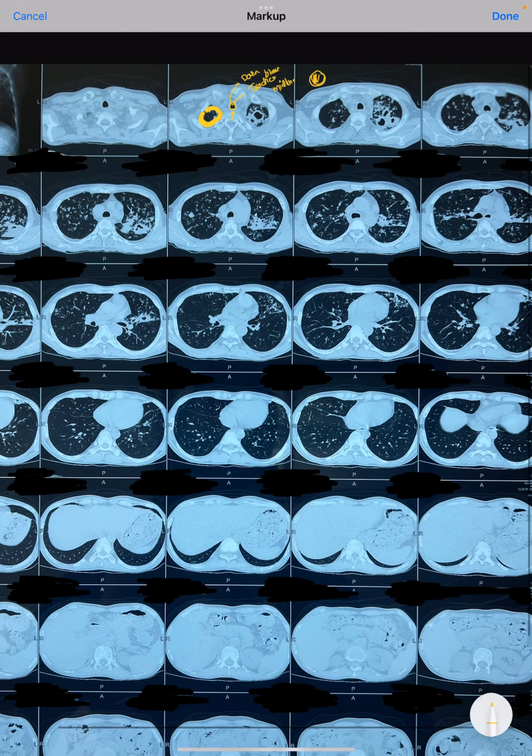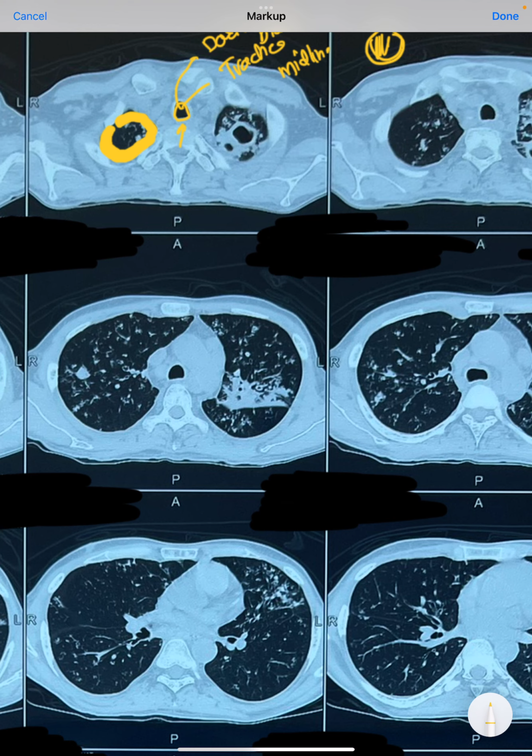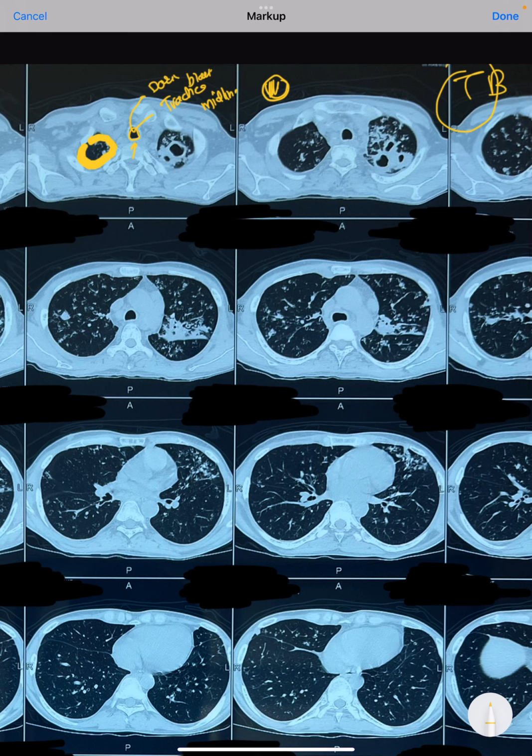With this type of cavity, almost always you have to think of tuberculosis, because in TB the formation of cavities is extremely common. And what we need to know is that such cavitary lesions give so much opportunistic chance for infection. The risk of opportunistic infection markedly increases if there is a cavity, because the immunity here, all the CD4 cells, CD8 cells, or the local immunity cannot effectively combat the bacteria, or viruses, or the fungus which are present there.